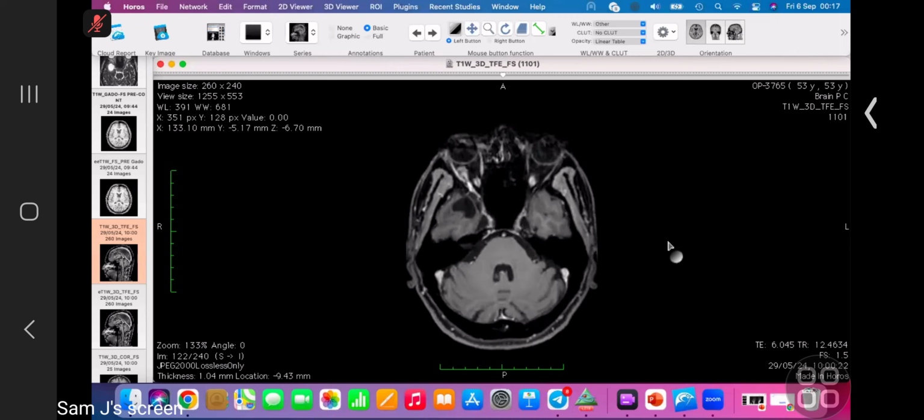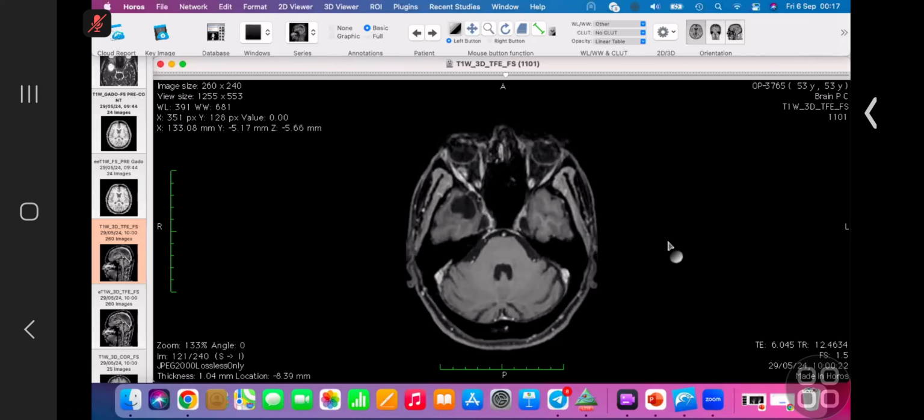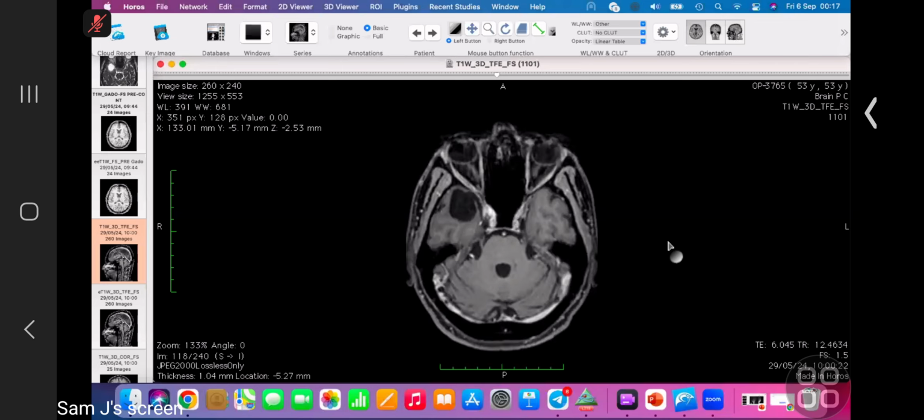To summarize my case, I have been presented with a brain MRI for an adult patient with history of headache, which showed a well-defined mass lesion in the right temporal lobe, which appears hyperintense in T2, hypointense in FLAIR, and didn't exhibit any contrast enhancement after giving IV contrast, and it showed a similar signal to the corresponding CSF.